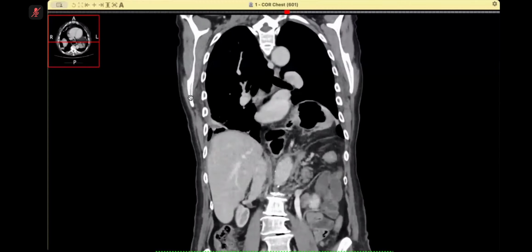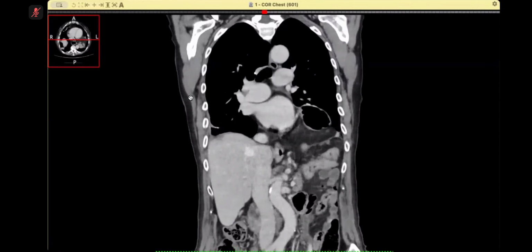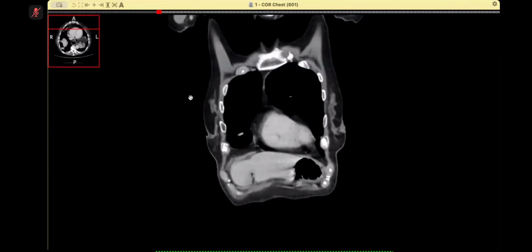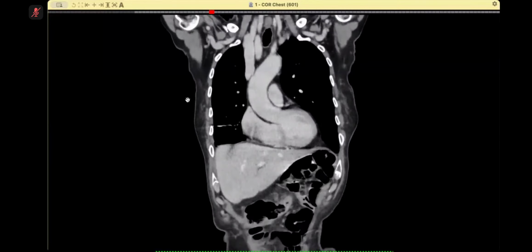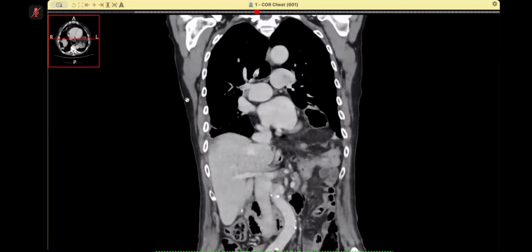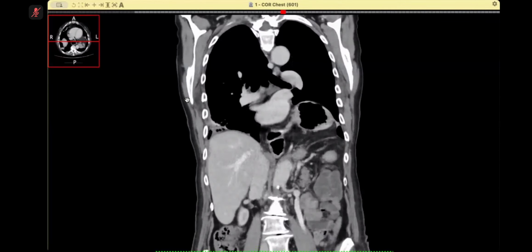So I'm going in one direction and then I'll come back. So I've gone anteriorly. Now I'm coming back, going backwards.